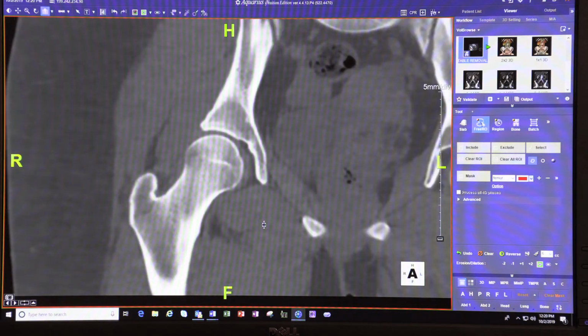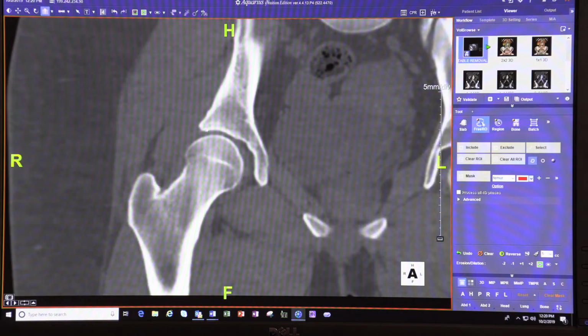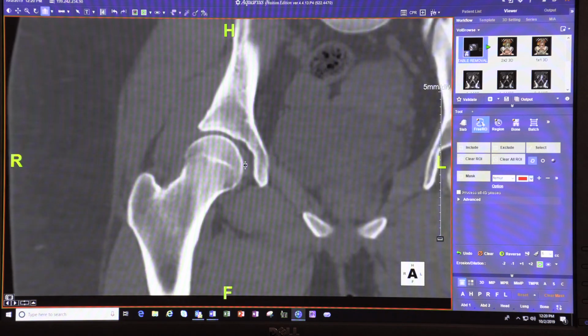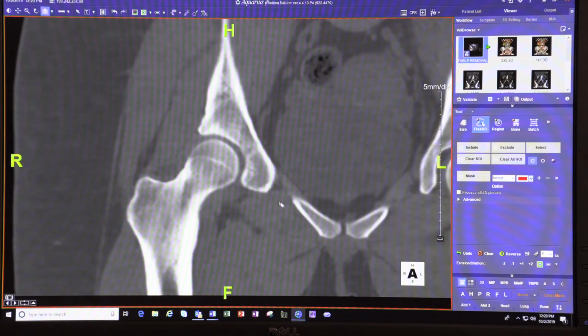On the CTs or cross-sectional images like 3D MR, you're going to miss the upsloping of the acetabular roof. You're going to miss that if you do it in the center or posterior. So you have to come a little bit anterior. That way you can see these slopes, which are altered slopes. It's not like a flat slope you're seeing. And usually the recommended is that you come anterior.